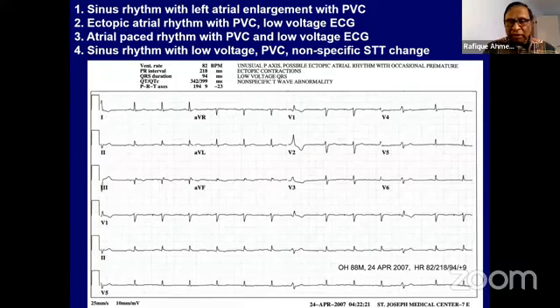So some said sinus rhythm, one physician said so, and then ectopic atrial rhythm. Sure, these are all reasonable choices because there is a P wave before each QRS complex, and the P wave looks funny in leads 2 and 3, and that gives the possibility of ectopic atrial rhythm or sinus rhythm with left atrial enlargement. However, it's a little difficult to see, and there is no E, but I'm sure that's D.